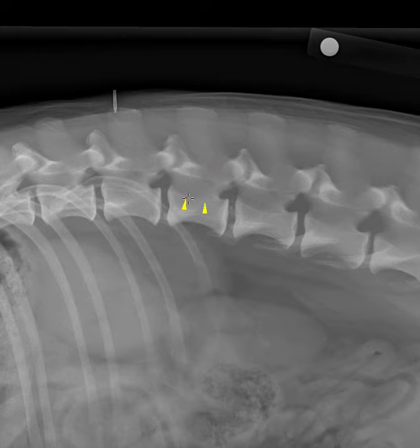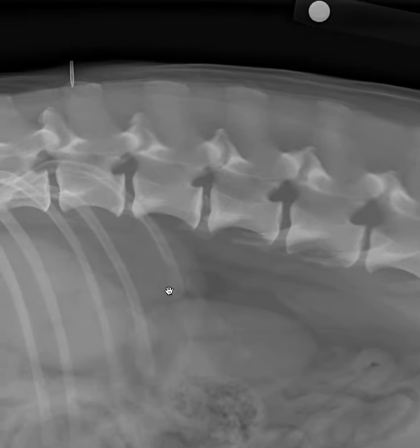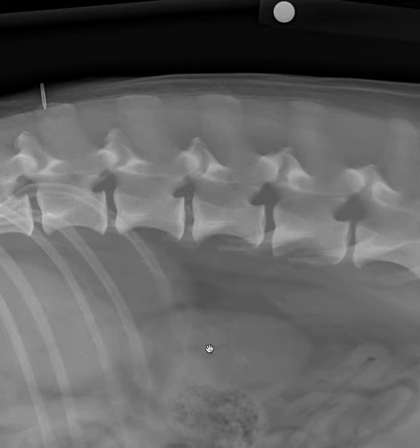So now that I've expressed my subroutine and the details that I look at for spine, I want to point out some specifics in this case that you might have noticed as we were talking along. This is T13 with the last two ribs. Here's L1, L2, and L3. I want to focus on L23 for the rest of our video.